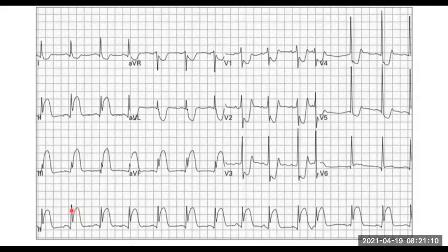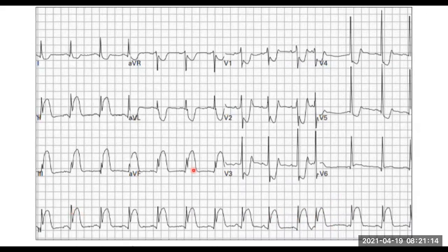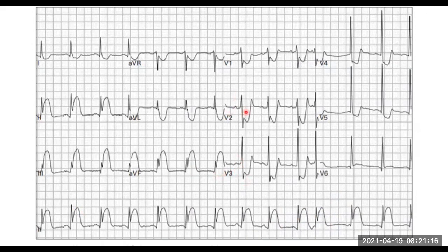And then the next thing is our QRS complexes, are they narrow or wide? Narrow actually, eh? Narrow, because remember, this is actually a QRS complex, this little thing here. And then once it changes, that's your ST segment. So all that we're seeing that making it look wide is actually an ST segment. So you're not wrong to say that it's wide, but you understand why it isn't, you know? And most particularly, you can see the thinness there and see the thinness there, all right? So these are actually thin QRS complexes, all right?